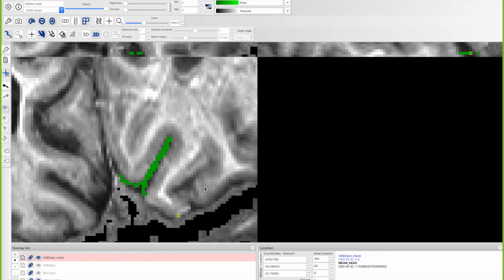Maybe this should be still the borderline. I'm usually conservative and make the borderlines between, for example, here, gray matter and CSF further towards CSF, because later you can always cut it. And I rather draw the borderline slightly above gray matter.